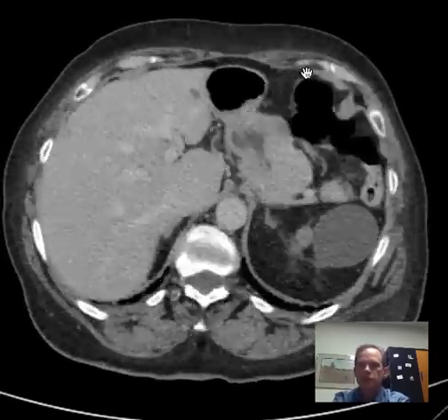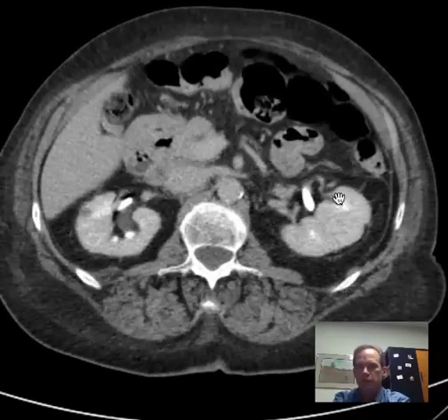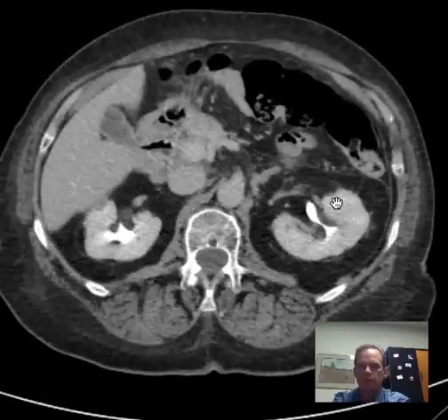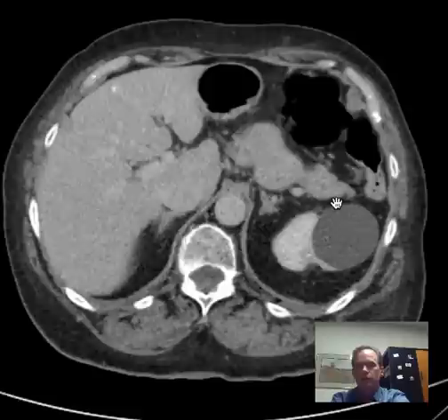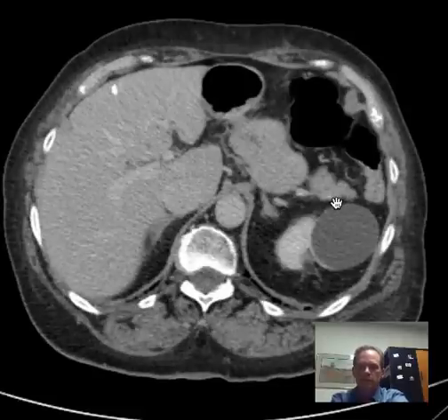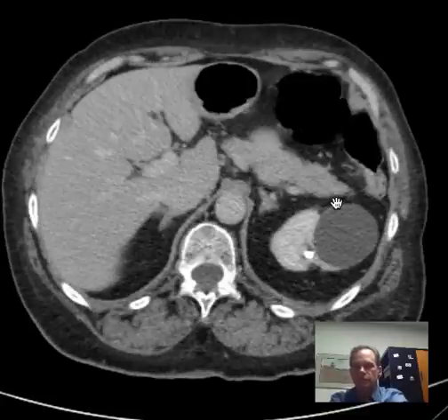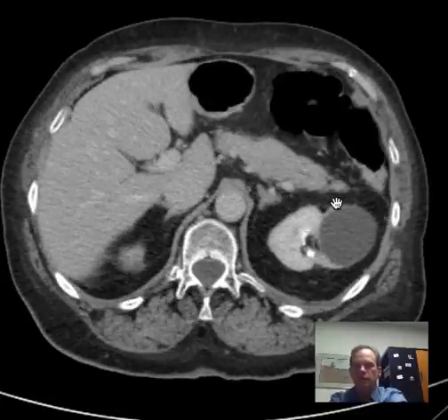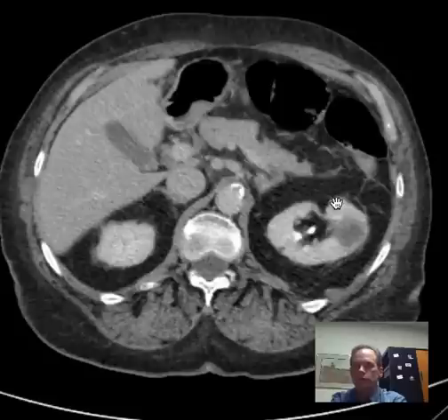So you probably noticed right off the bat that there are renal cysts. Okay, well that's fine. They're usually benign. You should learn the Bosniak categories, B-O-S-N-I-A-K, which is something that's come out in the past few years and has helped us with more certainty determine whether a cystic mass of the kidney can be left alone or whether it needs further evaluation.